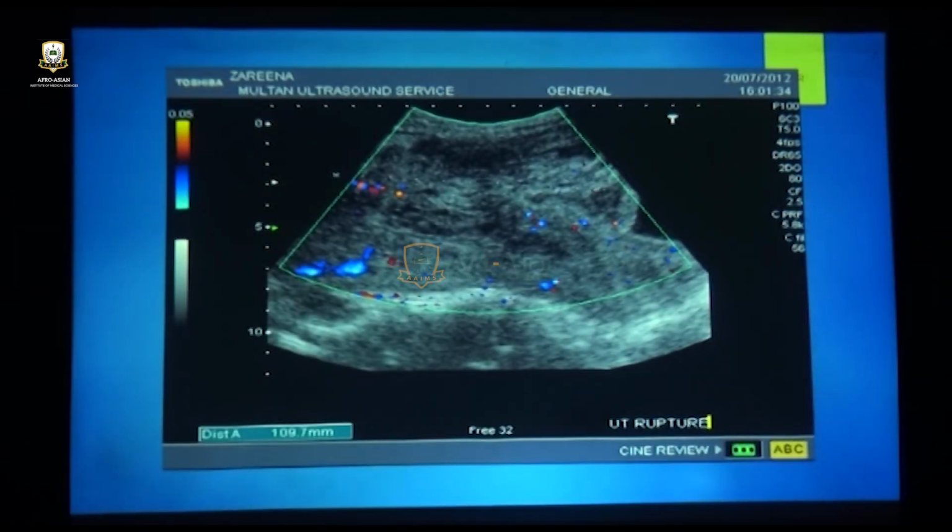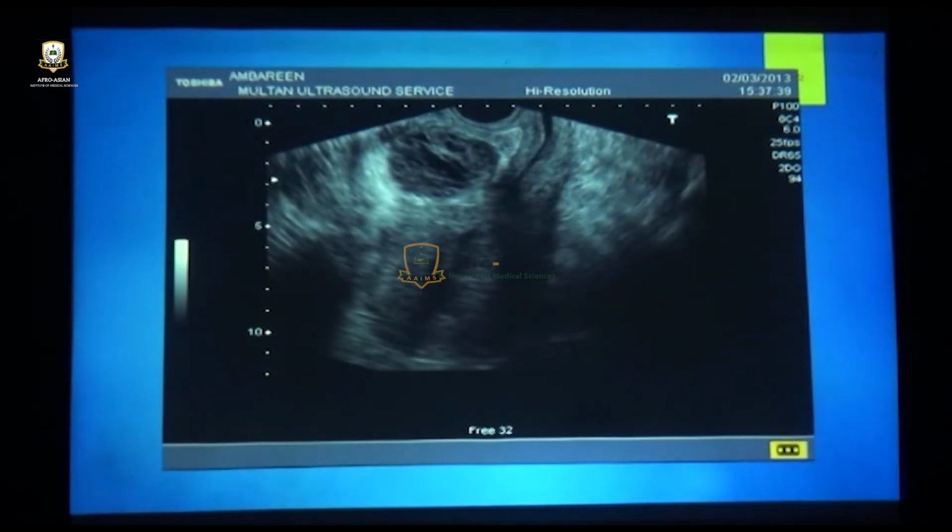Last few slides of uterine trauma, sometimes during instrumentation. Here you can see the anterior wall is ruptured and there is a hematoma adjacent to the uterus. Hematoma at the C-section.